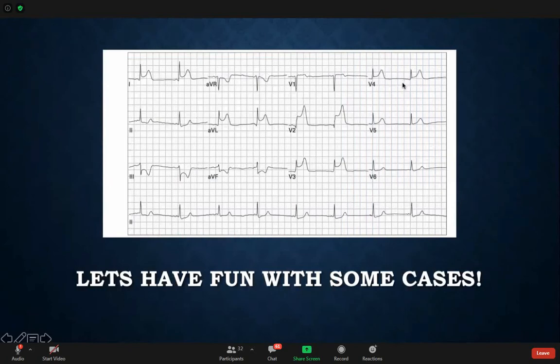I want somebody to read this ECG for me. I want them to read it and come and talk, just unmute themselves and talk. So who's willing to try? It's normal, nobody is going to get it all right.